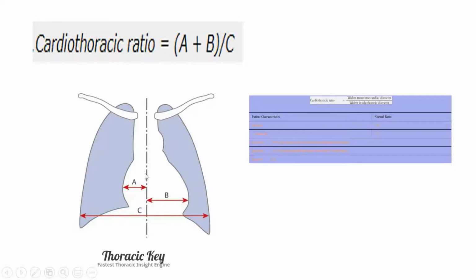Then another important thing: how many times do you get a patient or a referral from primary care or internal medicine for a patient whose chest X-ray is showing cardiomegaly, but when you do echo, there is nothing. So how can you explain that? Now, the mic is yours. How can you explain that? Maybe the X-ray was taken during expiration. Okay, good. So the phase of the X-ray acquisition.